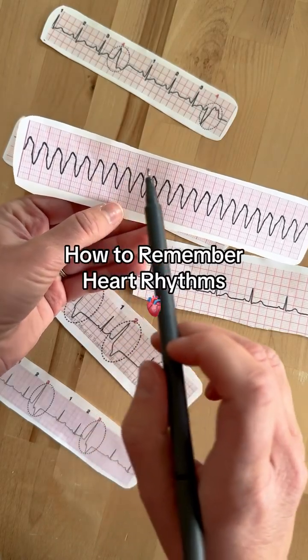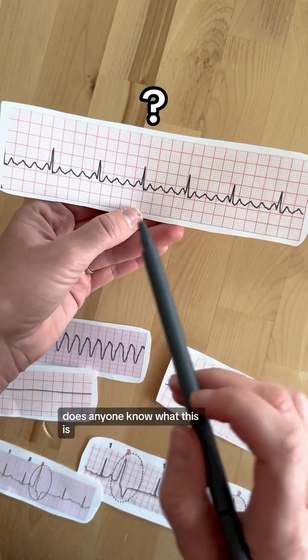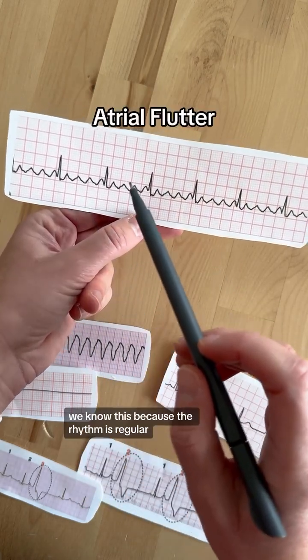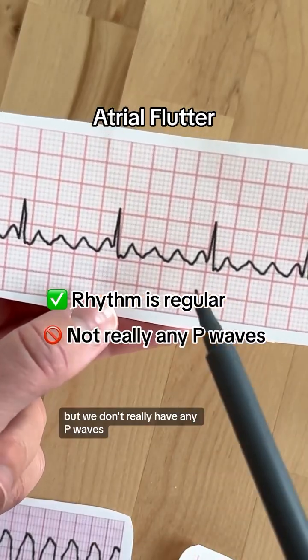Let's test your knowledge on EKG strips. Okay, the first strip is this one. Does anyone know what this is? This is atrial flutter. We know this because the rhythm is regular, but we don't really have any P waves.